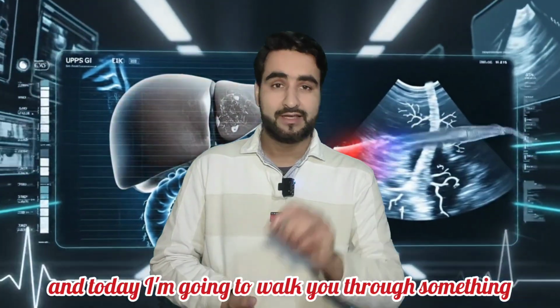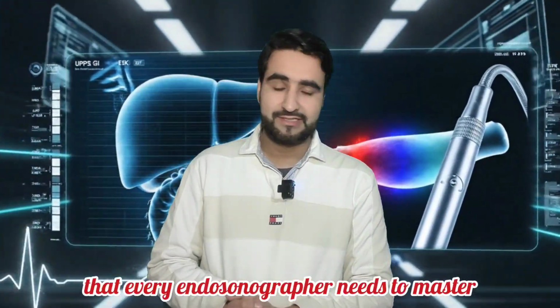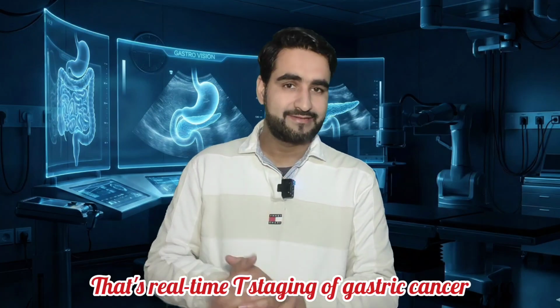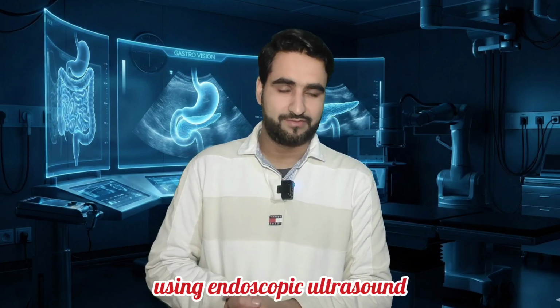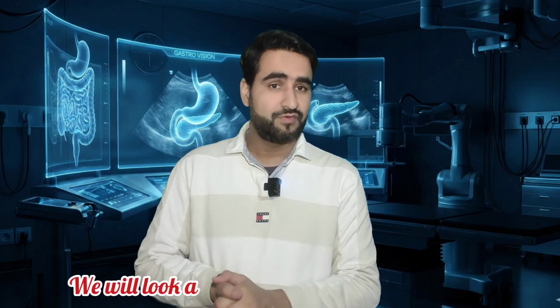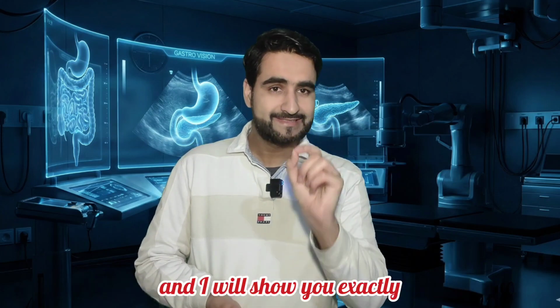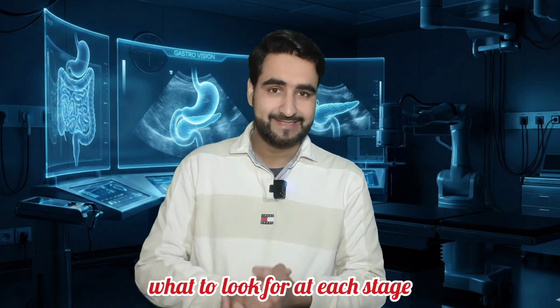I'm Dr. Kazi Suhail, and today I'm going to walk you through something that every endosonographer needs to master. That's real-time T-staging of gastric cancer using endoscopic ultrasound. We're not talking theory. We will look at actual EUS images case by case, and I will show you exactly what to look for at each stage.